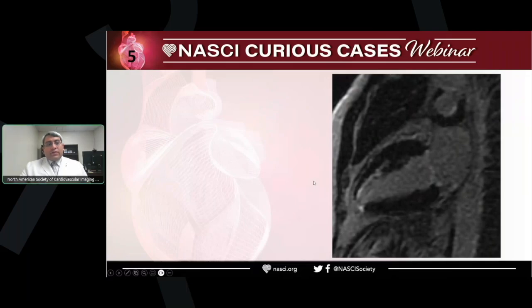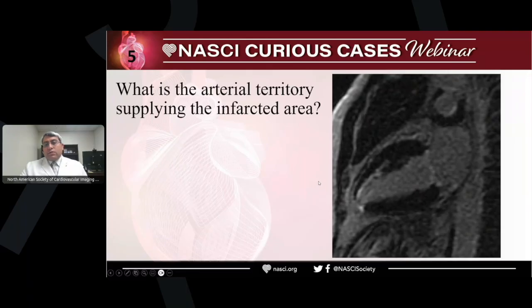Okay, next case. Who can take this case? LAD? LAD, exactly, thank you.